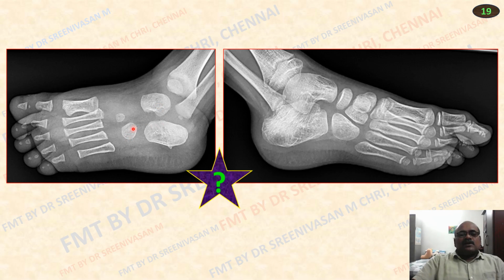All more than the 9th month. This lateral cuneiform also appeared, more than 1 year, right? More than 1 year lateral cuneiform appeared, but this medial cuneiform is not present here, which appears by 2 years.